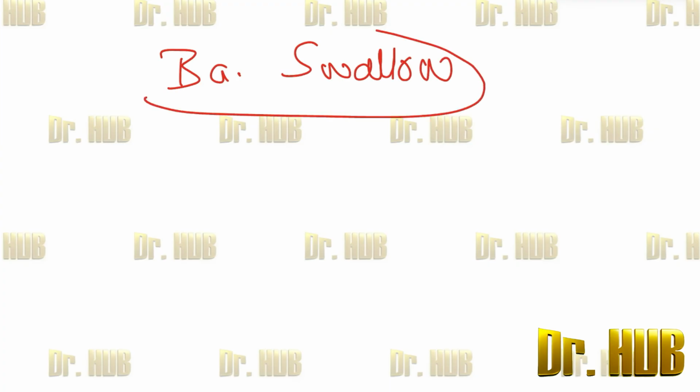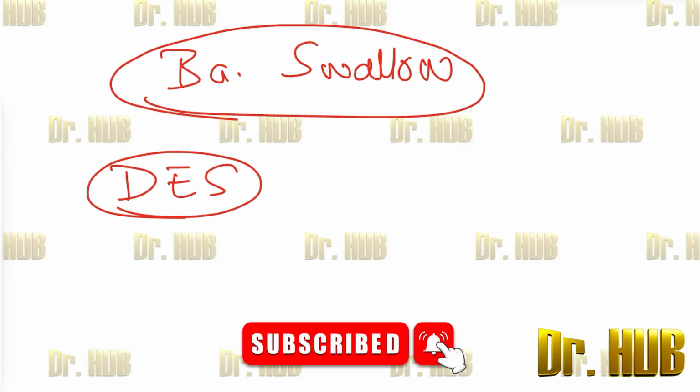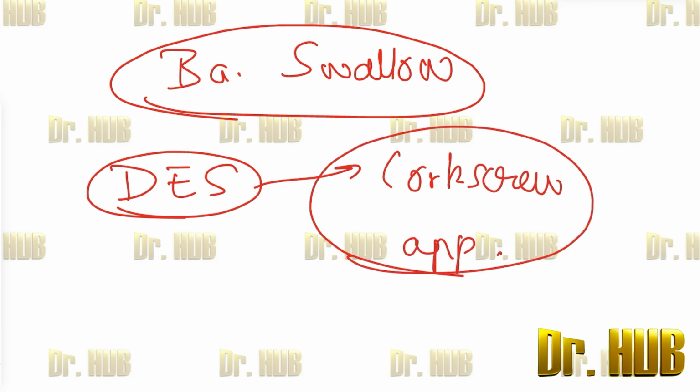Now let's understand the barium swallow in detail and some very important radiological findings. In case of DES, as we know, it stands for diffuse esophageal spasm. In DES, the corkscrew appearance is seen on the X-ray.